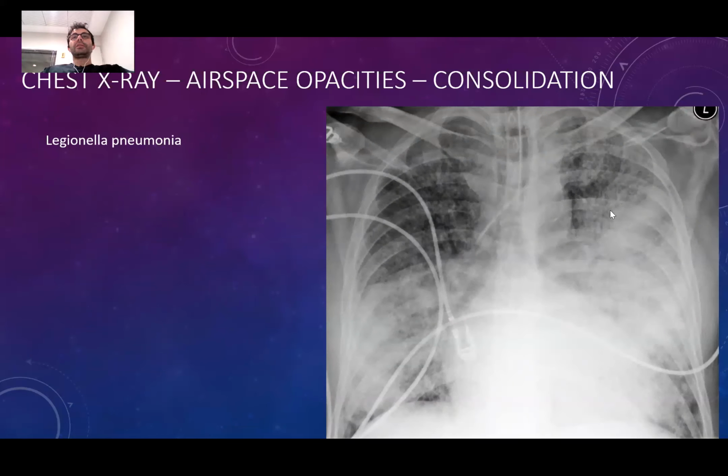The patient is intubated. It has consolidations on the left and right side. And there is also some linear linings as well. The reason that we are seeing this can also be because the patient is having some episode of heart failure at the same time because of the pneumonia. So pneumonia can cause heart failure as well.